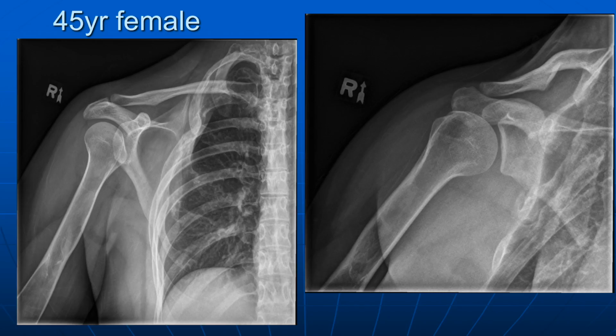Have you heard of the term ground glass matrix? Yeah, it's one of these terms that means nothing to anyone really, but people use it all the time. This is that so-called ground glass matrix. I didn't even really know what ground glass was, but it's, you know, in old chemistry bottles, the kind of top of it, that's ground glass. It's not a useful thing to correlate it with, but this is a ground glass matrix, and that is a fairly typical description of fibrous dysplasia.